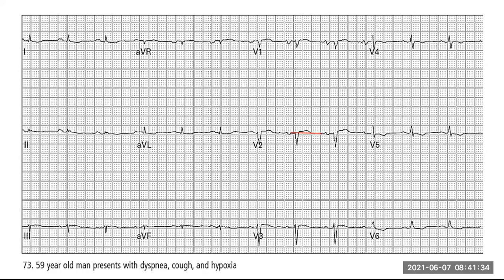Again, we see those T wave inversions, and leads 1 and AVL, which is also the lateral side of the heart. What do we see? Again, those poor QRS complexes, so what do you call that? That's called poor R wave progression, isn't it? There are quite a few reasons for that. And then we see these T wave inversions. On AVR as well, we just see this evidence of a right bundle branch block. So we've got a whole lot of things, nothing specific.